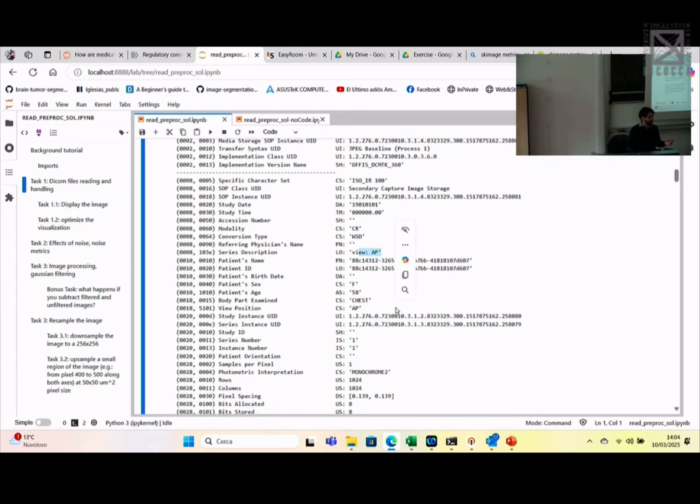And it might be wrong, as it can be manually modified patient per patient. It tells you the acquisition direction, the body part, the patient age and sex. Birth date has been removed, because of course all the data that you will ever work with are anonymized. And now also the demographics, especially the demographics, are manually filled, so they might be wrong.